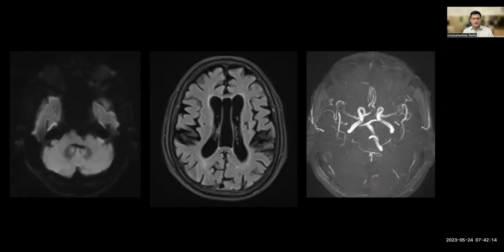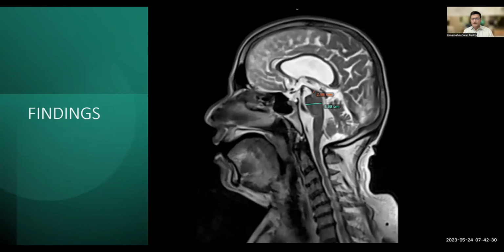Okay, these are the second set of images. What are the findings in these images? Okay, let me explain the findings.